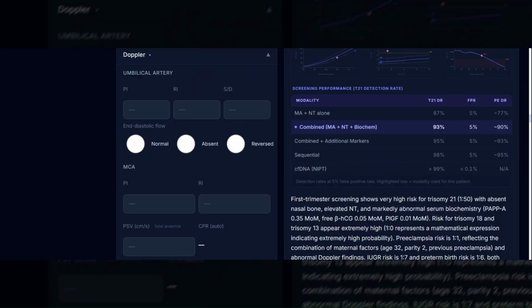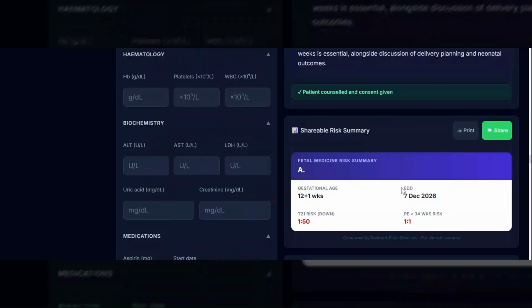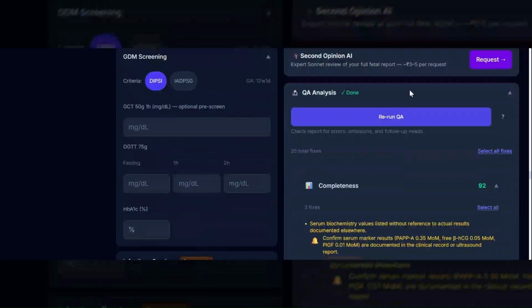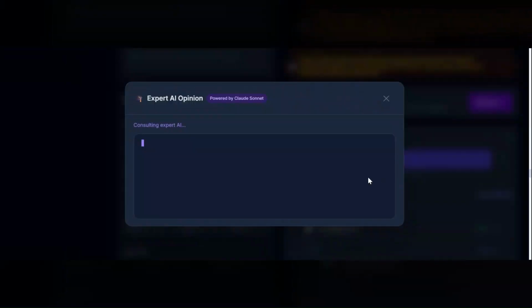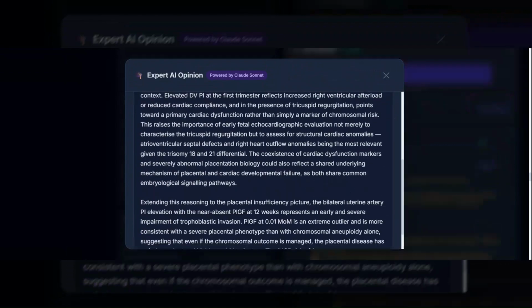consistency. There is a quality analysis QA check with clickable options to complete and refine the report and smoothen any pitfalls or overlooked segments. Also, a second opinion can be generated to further analyze and understand the nuances of the findings for clinical discussion. It can also be incorporated in the final report.